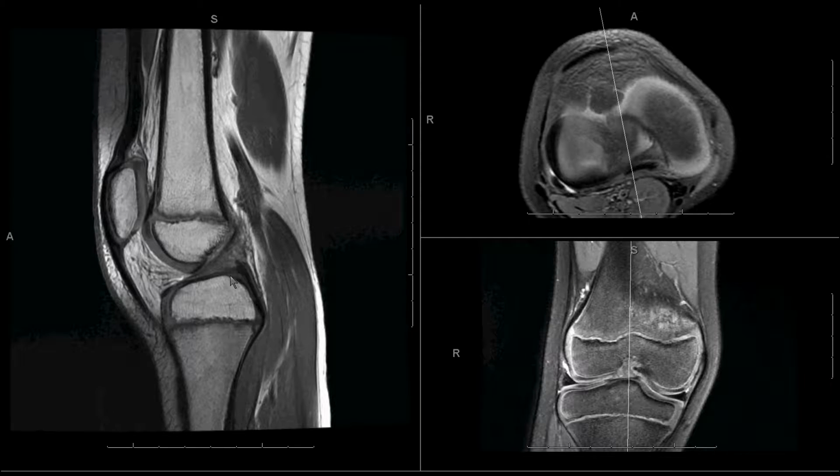So in order to talk about internal derangement in the knee, probably it's best to show a normal knee in an adolescent child and then to show some examples of some of the typical diseases that make pediatric musculoskeletal imaging different from adult MSK imaging. So first, let's start with the normal knee, and this is an order that you don't necessarily have to follow as long as you do cover all of these essential structures.